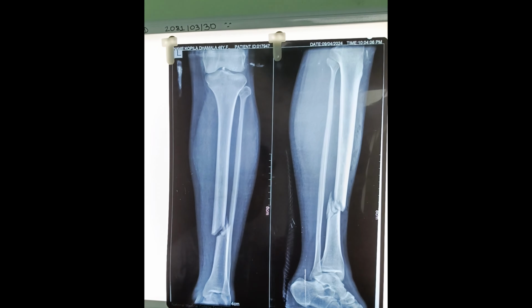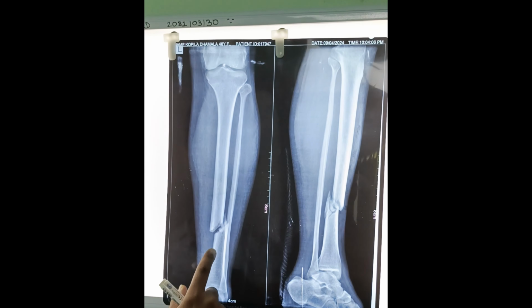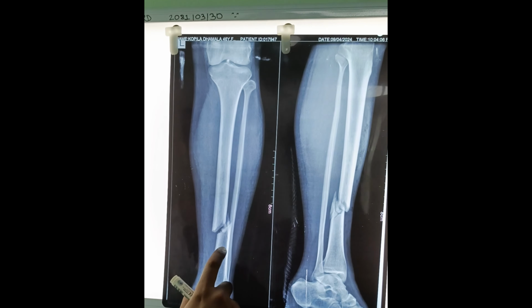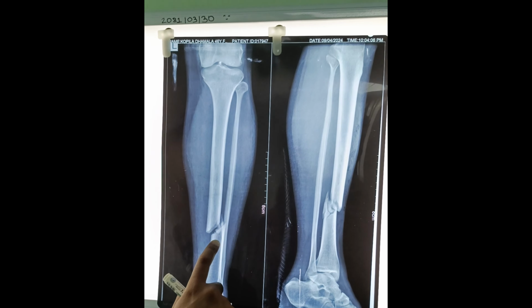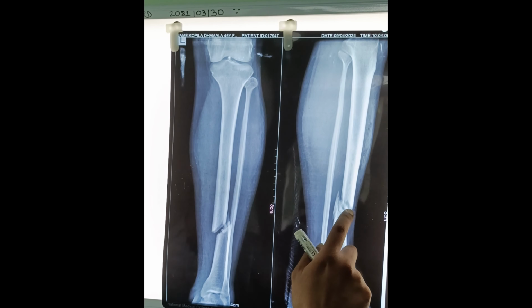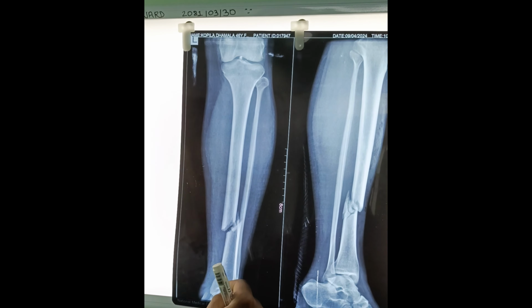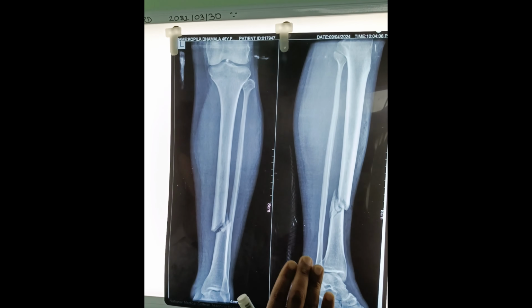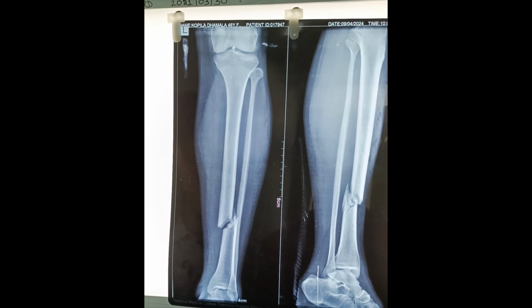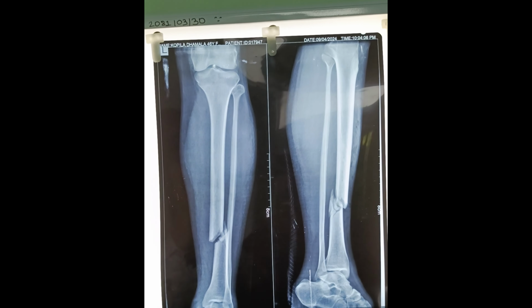A combination is there. When describing the displacement of the fracture, you find there is a proximal shift of the distal fragment, there is a lateral shift, and there is no angulation but some kind of rotation you find in the lateral view. Since the fibula is intact, not much displacement is noted and not much rotation is noted in this fracture. The soft tissue seems okay, and the ankle joint and the other joints also seem okay.